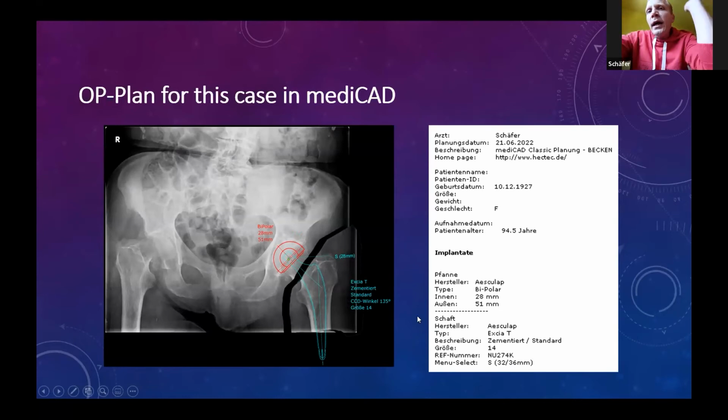I plan on the anterior posterior. I do not plan on the lateral. But you can. From my experience, you don't have to do this. I didn't have a problem because I plan only on the anterior posterior. You can, and that will be better, but that will cost you more time. That will function.